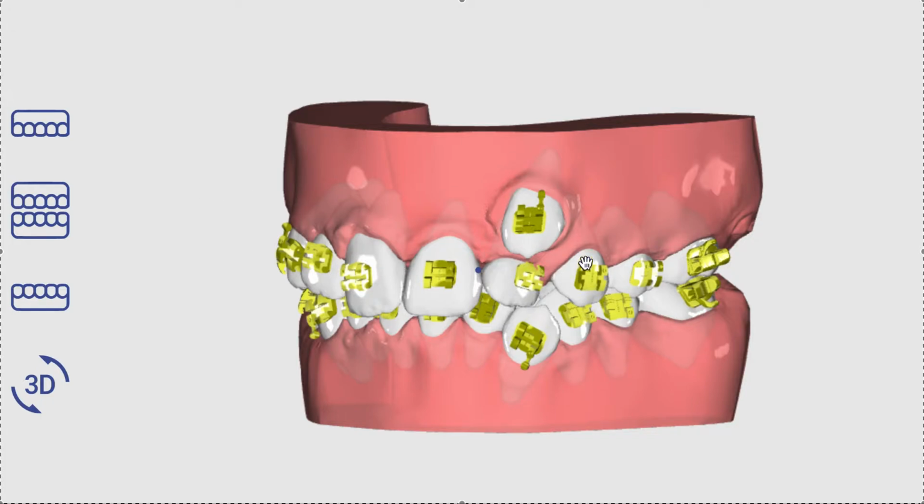Like, let's say, for example, this was actually transposed and we had to put it here and move that there. I don't know, because I don't have the CBCT. This is not my patient. I got this patient from Global. They gave it to me and said they had a release on it and I could share it. So my bracket positioning on this is going to differ than if this goes here and this goes there, for example. So it is very accurate digital bracket placement.